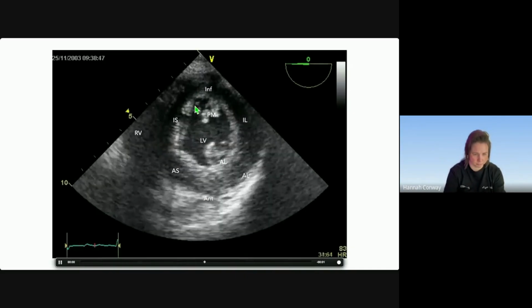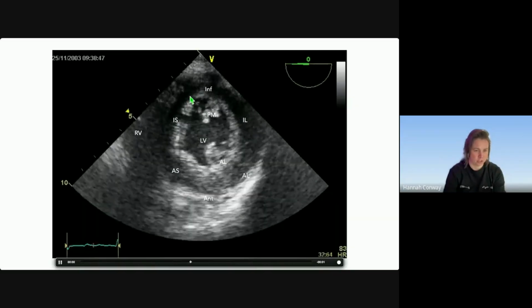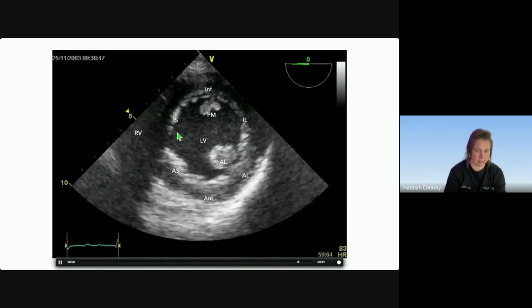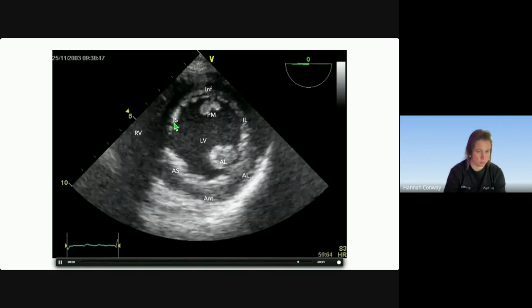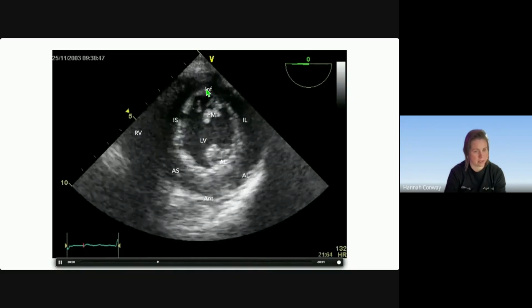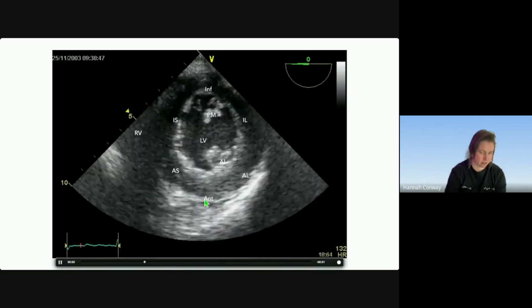First of all, go back to a 4-segment model and use the first wall that you definitively know is the septal wall, because it obviously separates the left and the right ventricle. Opposite that septal wall will be a lateral wall. The probe is closest to the inferior wall, so that will be your inferior, and then opposite to that will be your anterior. So we've got 4 segments.